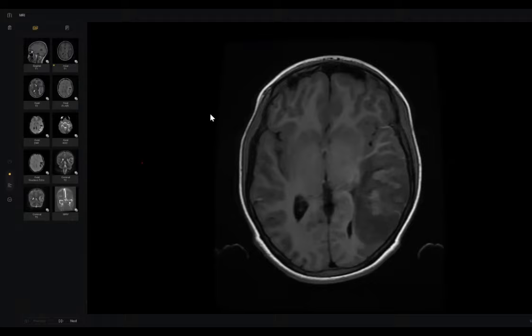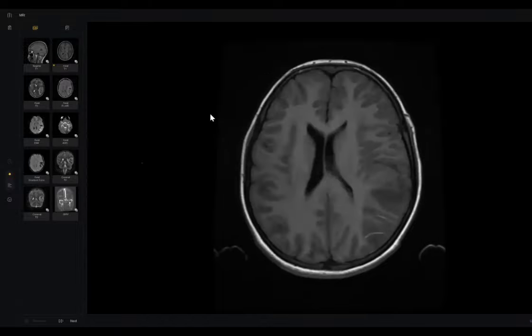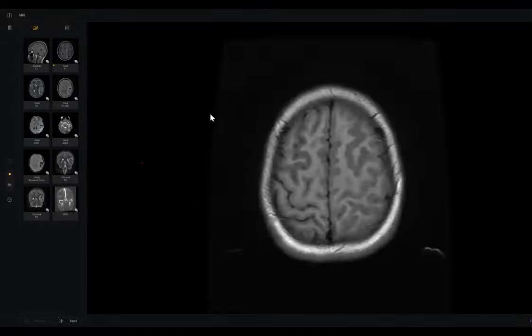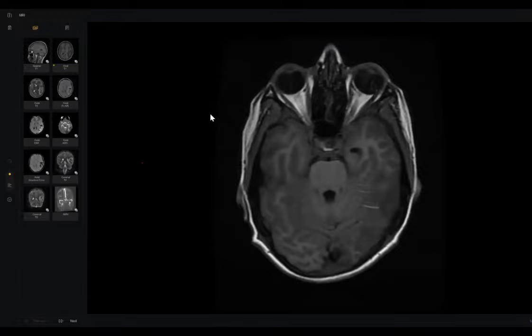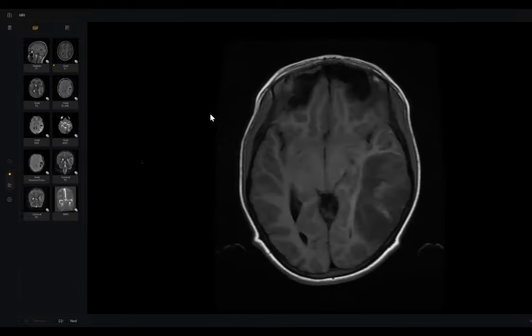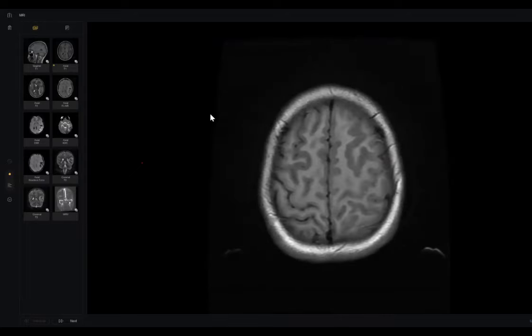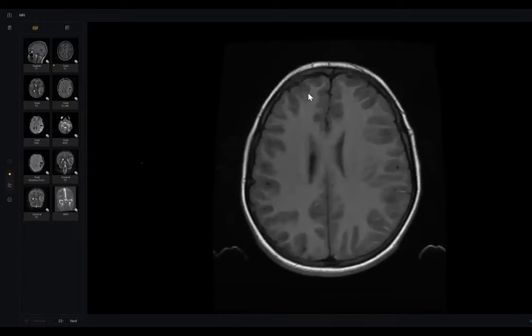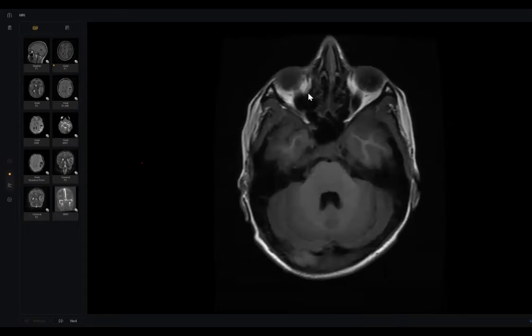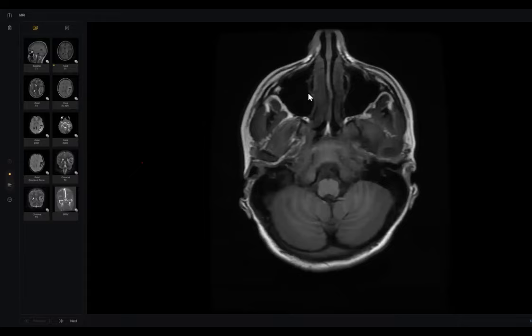If there is an acute presentation, this could represent an ischemic event as well, and with a hemorrhagic component, I would like to look at the venous sinuses, on T2, to see any absence of flow void.